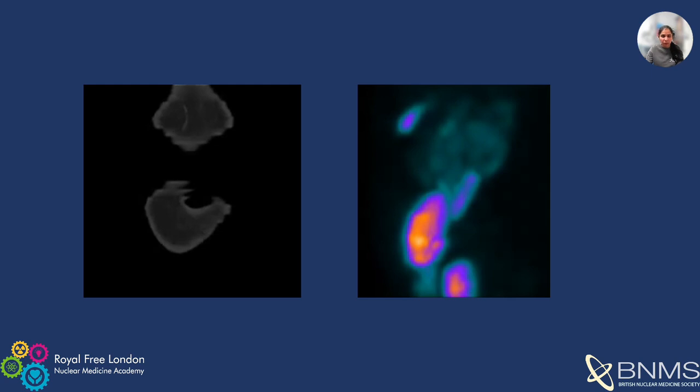After initial imaging, delayed images were required every 1 hour up to 3 hours, and then the SPECT-CT was performed. In the findings, there is a progressive accumulation of tracer within the parenchyma of the right iliac fossa transplant in keeping with acute tubular necrosis. There is urinary leak with tracer visualized within the collection around the ureteric stent as it passes through the pelvis from the transplant kidney to the bladder.